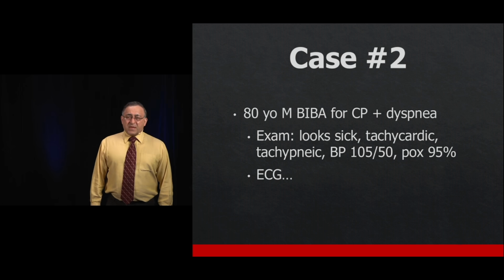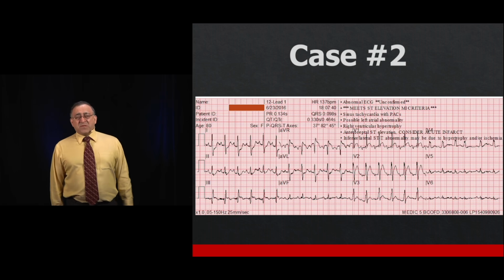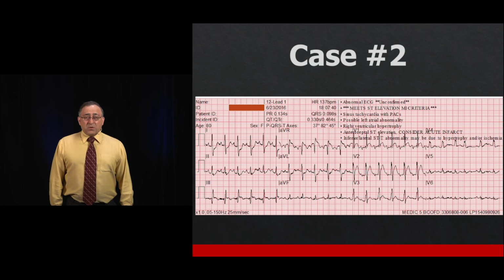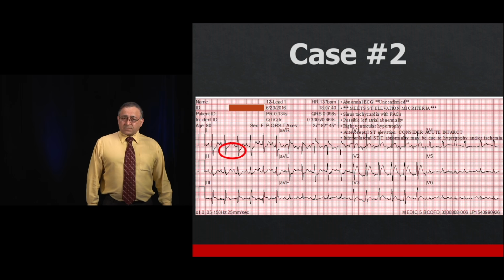Chest pain and shortness of breath. He looks kind of sick. He's a bit tachycardic, tachypneic. Here's the EKG, and this for all the world looks like a STEMI, right? ST elevation, V1, V2, aVR, which we've talked about, and in lead 3.